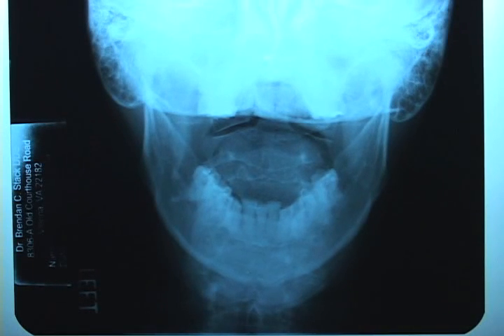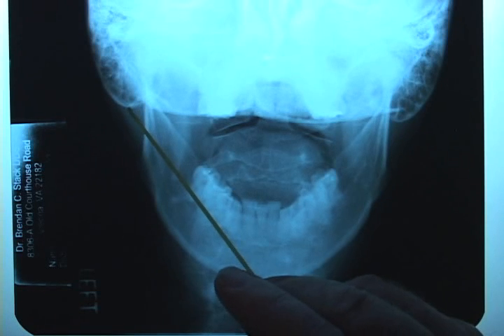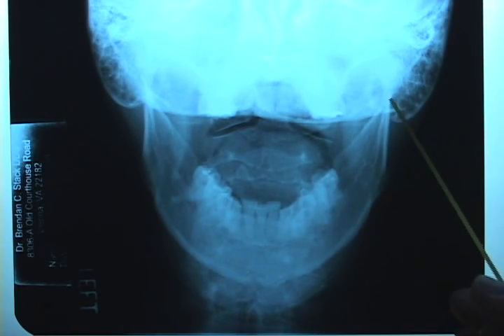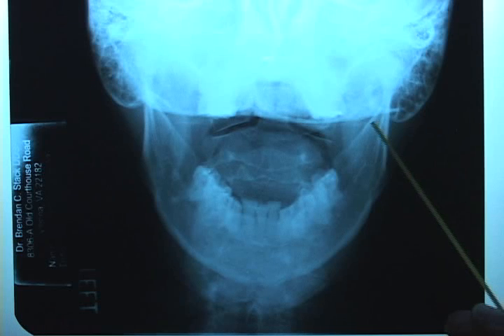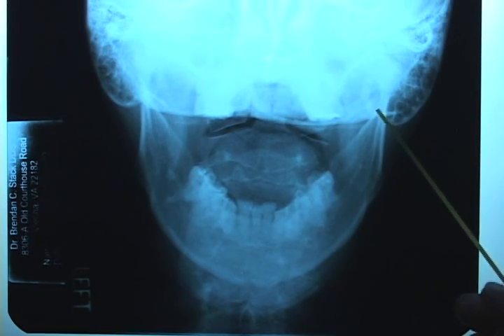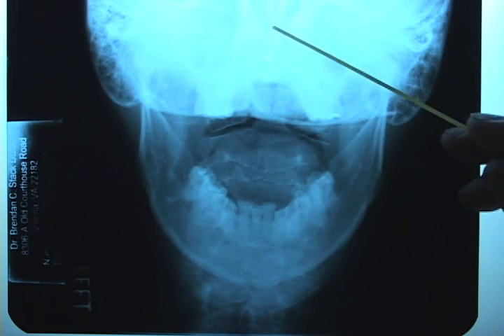This is this patient's frontal x-ray. You can notice that the mastoid processes of her temporal bone are not equally aligned. This one on the right side is caved in and closer to the midline than is the left. These temporal bones contain the glenoid fossas, so you can see that the glenoid fossas are not lined up symmetrically either. This is the probable reason why the disc on the right is picked up as being displaced by the MRI. You can also see that she has a deviated nasal septum right up here.